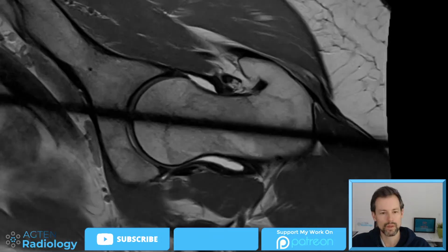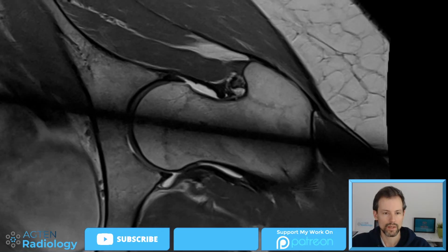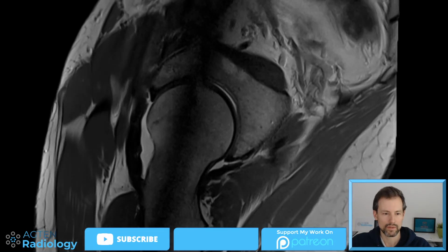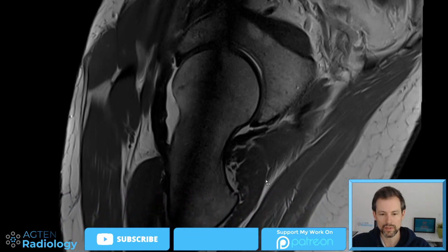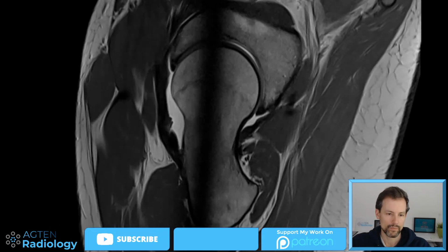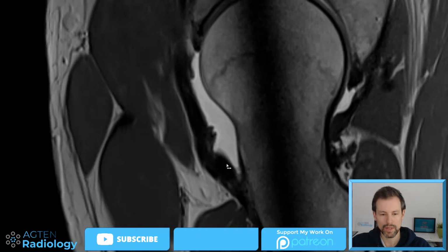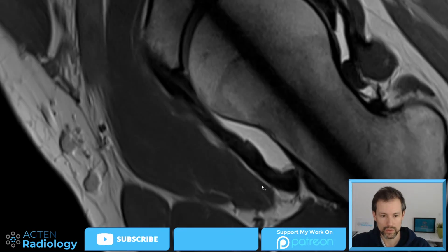All right, so now these are the anchors, and this is superiorly, more or less, laterally. If you want to know on radial imaging where anterior and where posterior is, just look at the gluteus maximus. It's easily identifiable here. So you know this is posterior, this is anterior. This is one way to do it. So what we are now trying to find are these two small sail-shaped adhesions in the lateral recess of the joint. Maybe this one or this one. It's hard to say.